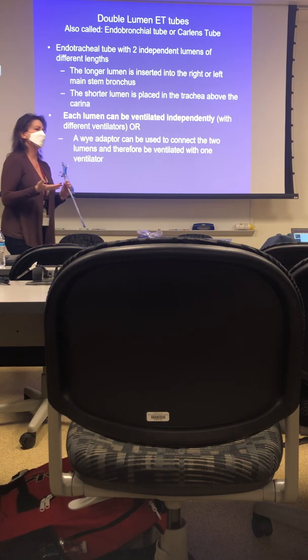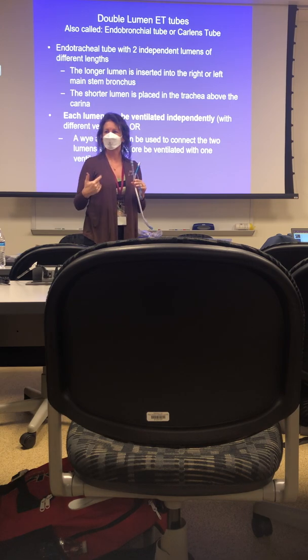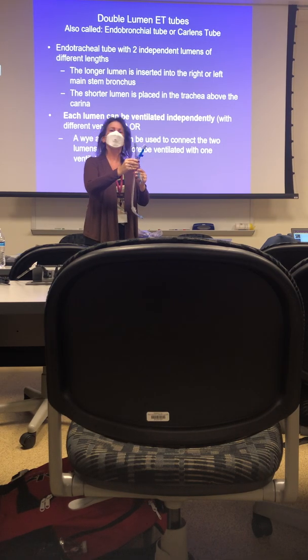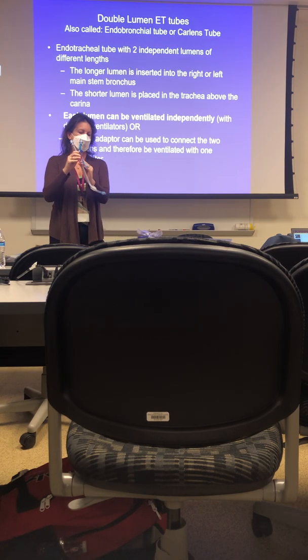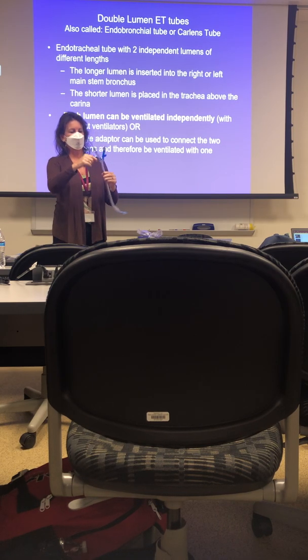So let's say the patient has right lung cancer, and they want to operate. Maybe they want to do a pneumonectomy. Okay, so they want to collapse that lung down so they can work on that lung. All right, so they can independently do that. All right, they could angle this towards the right, towards the left. All right, and you can blow up these balloons, these pilot balloons. I mean, it even says it.